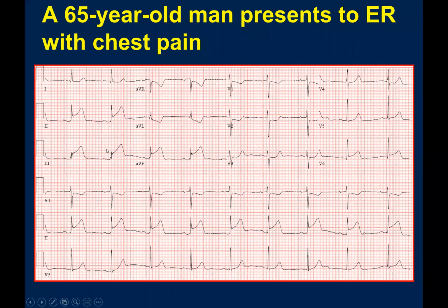For example, patients with inferior MI may present with complete heart block. If somebody just fixates on acute inferior MI and takes them to the cath lab, or if cath lab isn't available, gives thrombolytic, we may miss important conditions like complete heart block. This patient is actually perfectly sinus rhythm and regular. There's no block. But if you start systematically, you won't miss any other diagnoses, because sometimes the patient may have more than one diagnosis.